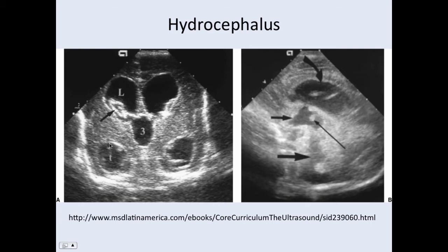These are very good areas to look at in terms of hydrocephalus. These are very sensitive early indicators of hydrocephalus because they dilate earlier than other parts of the ventricle. And so if you see that these areas of the temporal horns are getting dilated, that's a very good indication that there's hydrocephalus. On the sagittal image here, you can see that here's your third ventricle. That's bigger than it typically would be. And then here's your fourth ventricle, probably okay in size.